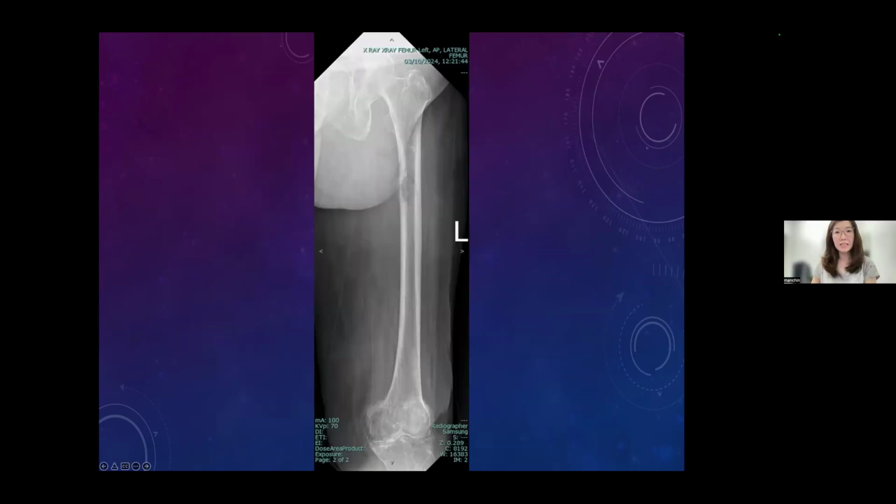Okay. Right, come next. What about this? An easy one. Okay, this one. Come on, guys. You all did so well already. This is an easy one.